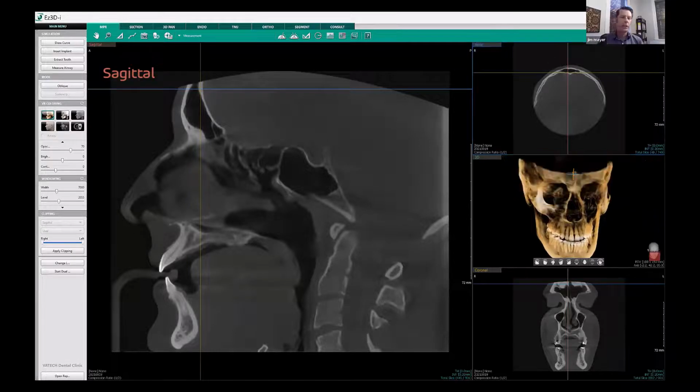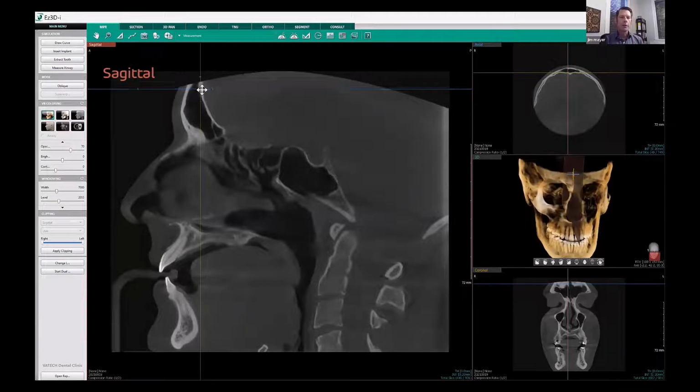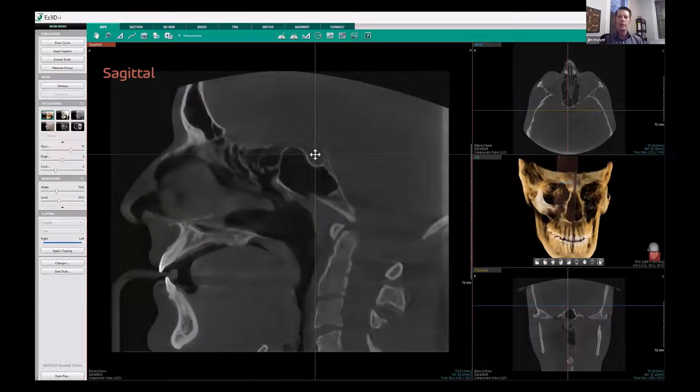Perfect. Well, thank you for taking us through that. And I wanted to follow up with one of the things you said about, if we're lost in the scan, you can navigate, basically, I call them the crosshairs, to a certain point. So we're seeing in 3 dimensions. If you did want to see the sella, you could actually take the crosshairs and put it right to that point, and then we're seeing it in all three planes of view, and it's even targeted on the 3D rendering right there too. Absolutely, it's an easy way to target and get our bearings, our orientation of where we're at.